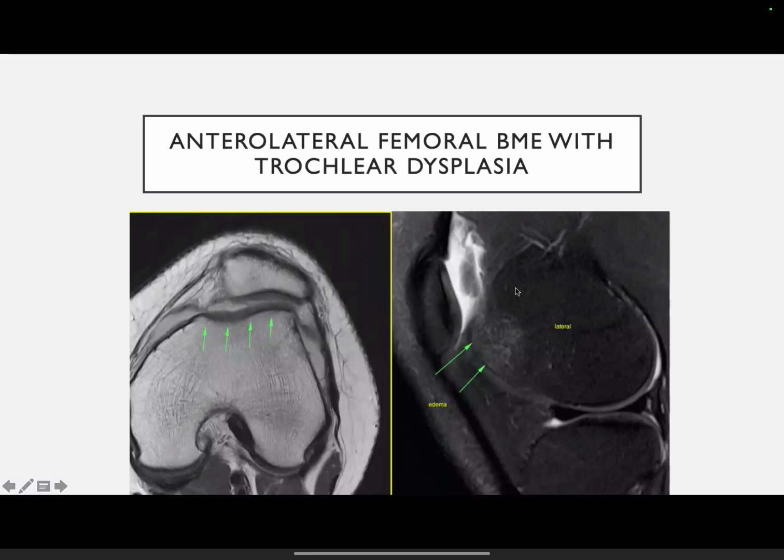So in such cases, when we have seen that there is a patellar dislocation event, we need to look at the status of the patella, its position and morphology, whether it is Wiberg type A, type B or type C. Then we need to tell whether it's a trochlear dysplasia or not. For trochlear dysplasia, we follow the Dejour classification, and we need to mention the type of dysplasia, whether it is type A, B, C or D, and give the TT-TG distance, the tibial tuberosity to trochlear groove distance, so that they can assess whether it needs a tibial tuberosity transfer or not.